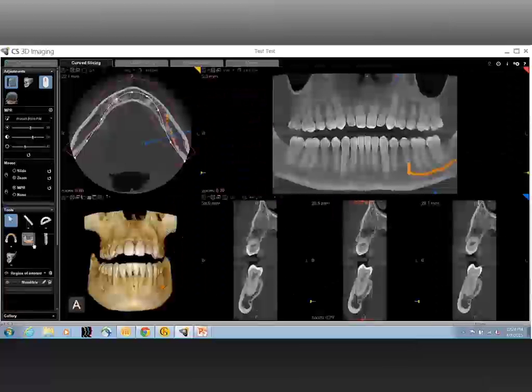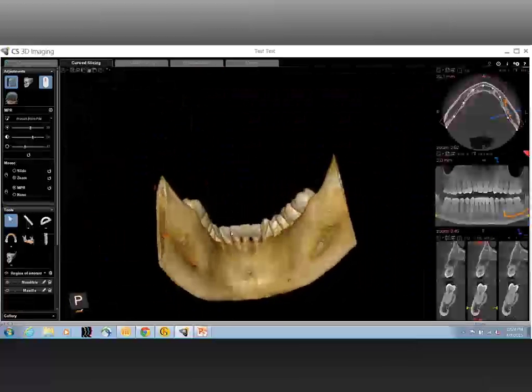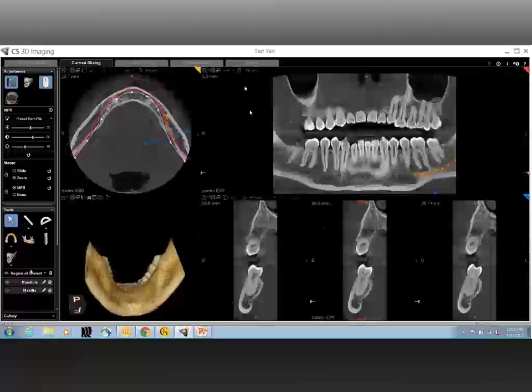Now, besides the mandibular foramen, we should also remember that we do have a lingual foramen that is ideally located around the genial tubercle, which is in the midline area between the two central incisors, as demonstrated. Right now, you can see it as a little hole. The lingual foramen opens into the sublingual space, so that is also a critical structure to be evaluated. So all in all, starting from cortical bone up to the lingual foramen are all critical structures that definitely need to be visualized and interpreted.